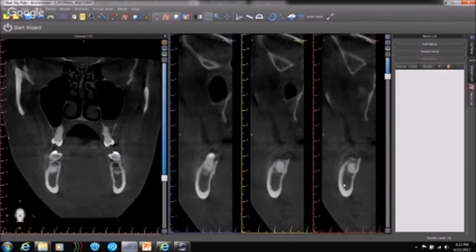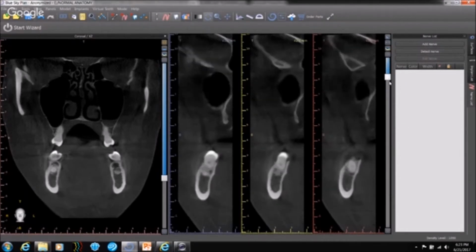All right. So in the cancellous bone area, the cancellous bone is contained over here. Now, if you do not see any trabecular pattern like you notice over here, and I do have another image to compare it to as well, we will get to it, it means there's less trabeculation, which means there's less density. So it's a little bit more detailed evaluation of the cross-sectional areas.